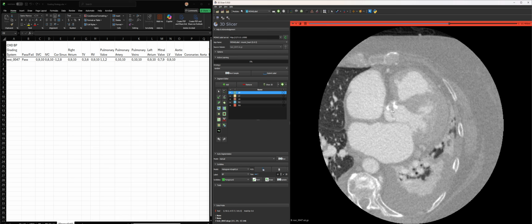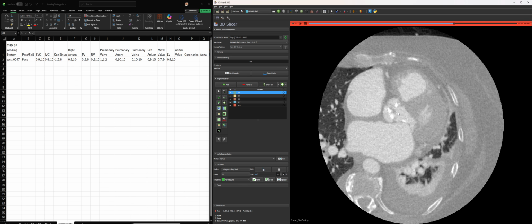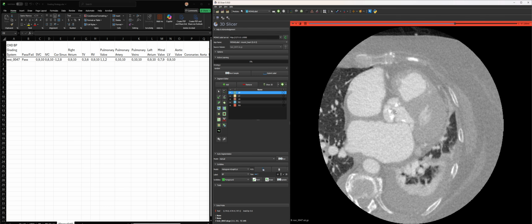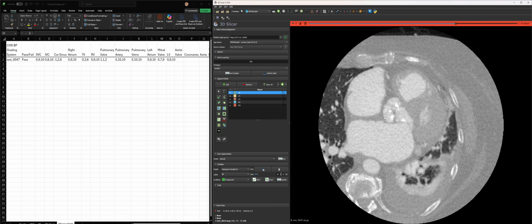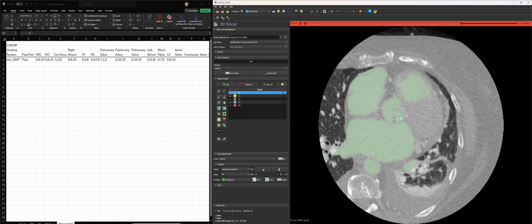So I'm looking beyond it and saying, how much of this valve do I think is here? Number one, you're probably going to have a thickened valve for the calcium to deposit on, so there's probably quite a bit there. I'd say possible 8. There's a lot of the dark valvular tissue, like here. Or 7. With the calcium, probably a 7 potential.